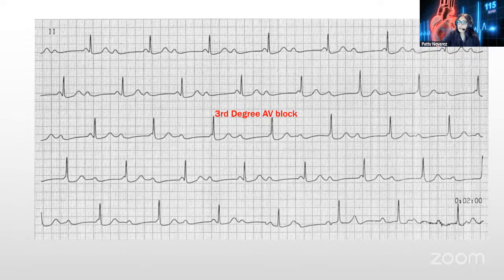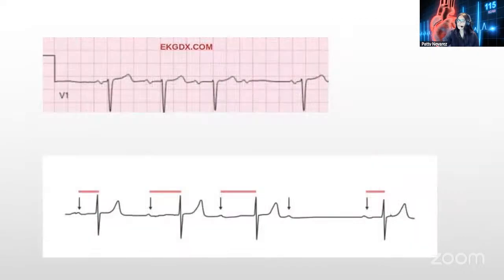I have one more sample. Okay, on this one, remember, depending on the lead that I'm looking at, in this case V1, and if you remember how the presentation is going to be, this is still a QRS. So the first thing I'm going to do is check if it's regular, where it looks like something is missing here. And then I'm going to go to my QRSs, and of course, it's missing.